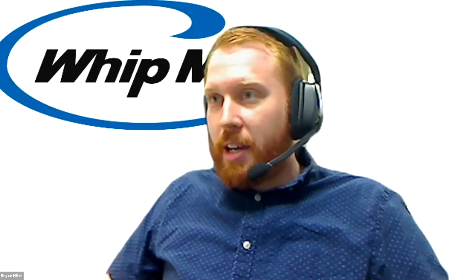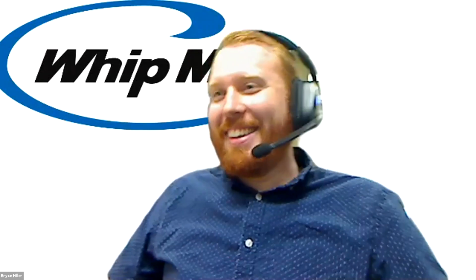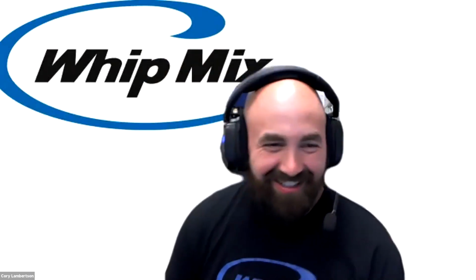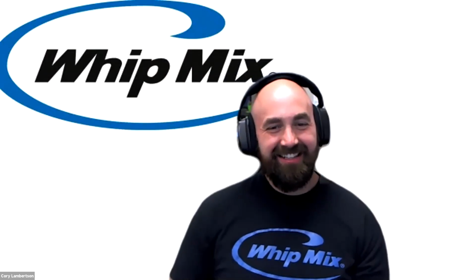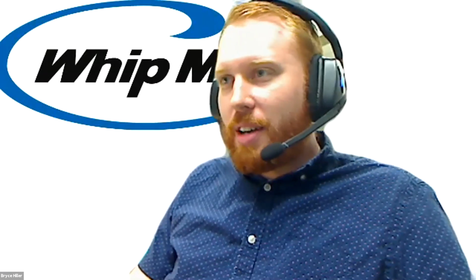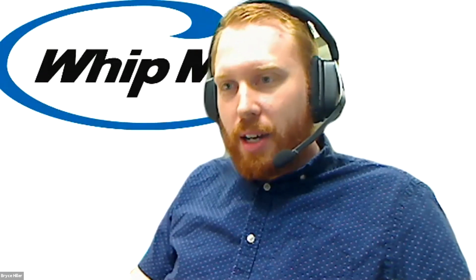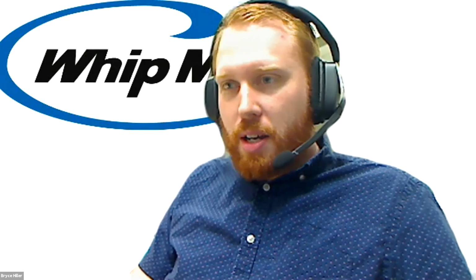The purpose of today is to show you how the software works. So if you want to criticize my design, that's cool. I know I'm probably not the best partial designer out there, so it's all good. So let's go ahead and get started.